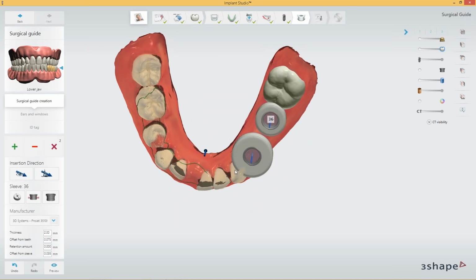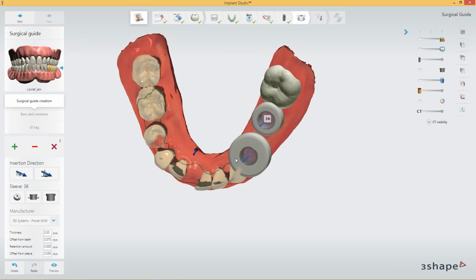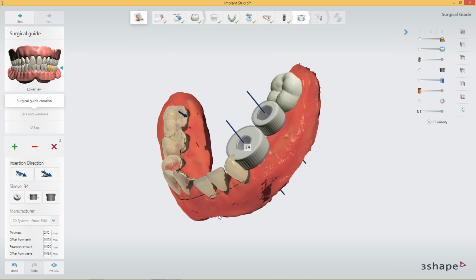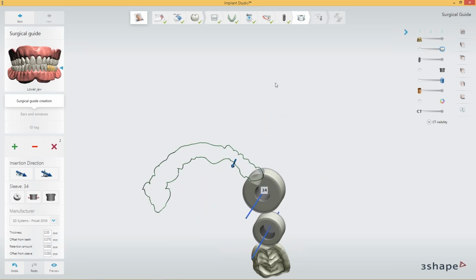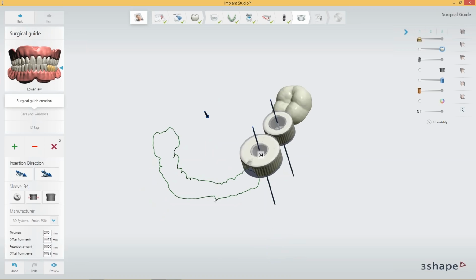So if I do it quickly like this, you can see that the outline will actually go in between the teeth a little bit. So if I remove the model, we can actually see the path that we have made, and it looks more like a serpentine or something else than a guide outline, but by smoothing it, we can actually get it nicer.